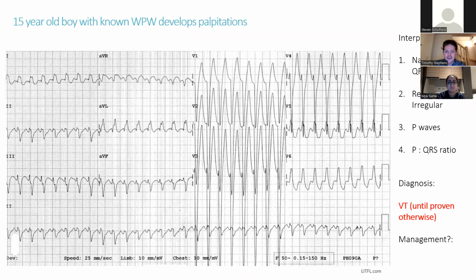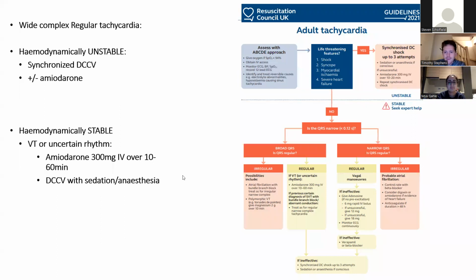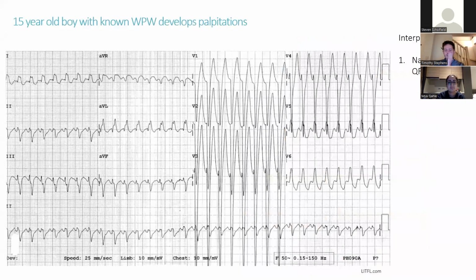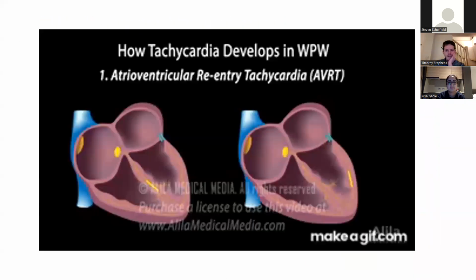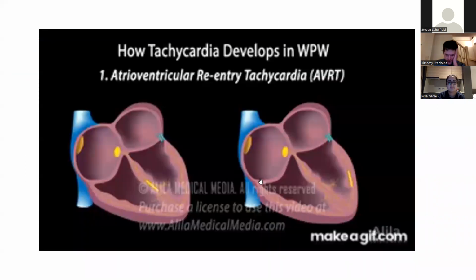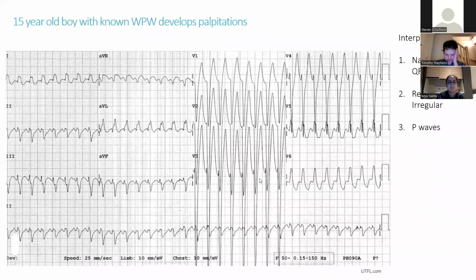However, saying that, oh yeah, this is just your pathway. So I'm saying you're probably going to shock this patient. If you're in doubt here, you could try amiodarone. Now, amiodarone is a drug, the Domestos of drugs really, but it also has an effect on your AV node. There's a reason that makes me a bit nervous about using amiodarone in this sort of case if it acts on the AV node. I'm going to illustrate that by asking you about this last ECG of the evening.